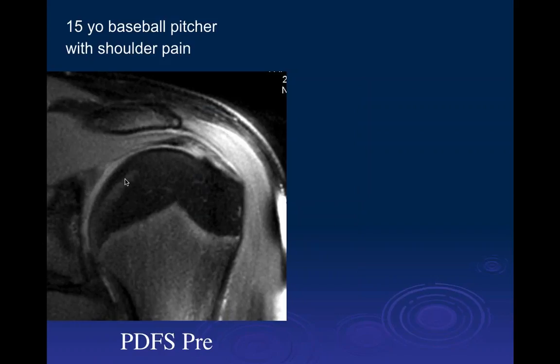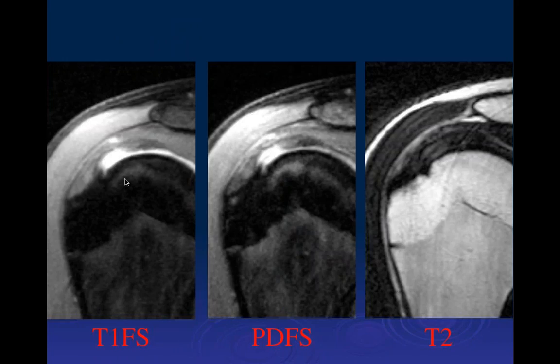John? Yes, John. Can you go back? On the T2 image, the right one? Yes. That's kind of a question as to the tear, isn't it? Yeah, see, this just shows probably a little tendinosis in that area.